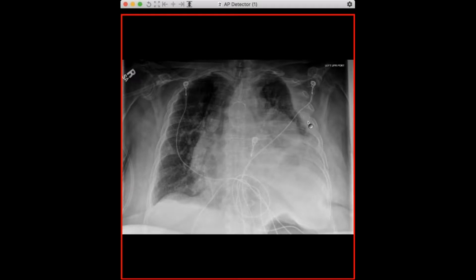So one of the things I always teach my junior residents is when you see new pleural effusion, especially very quickly, one of the things you have to think about is blood, especially after surgery. And we'll notice a couple of things. First of all, there clearly is a pleural interface out laterally, but there's also now displacement of the heart and mediastinum. We see the aortic arch is now superimposed over the spine, and you'll see it's a fairly well-centered radiograph.